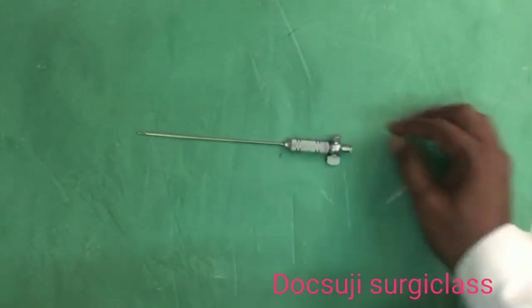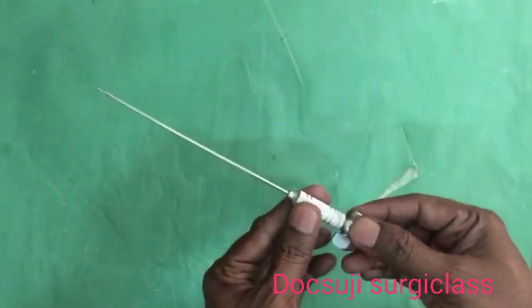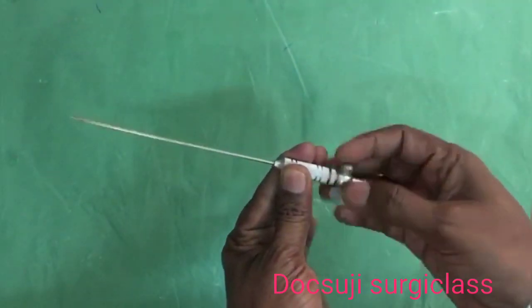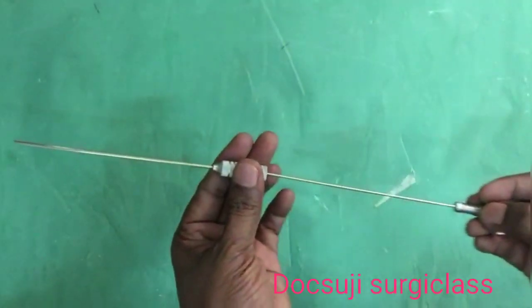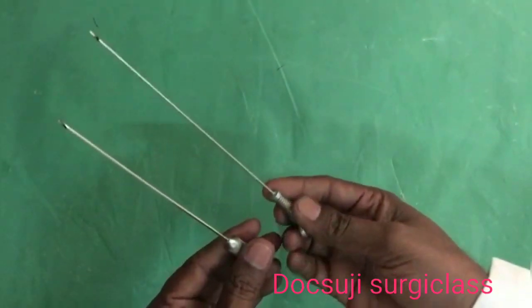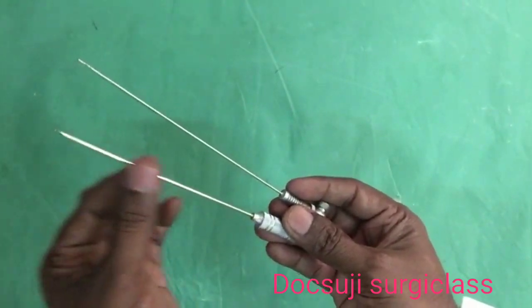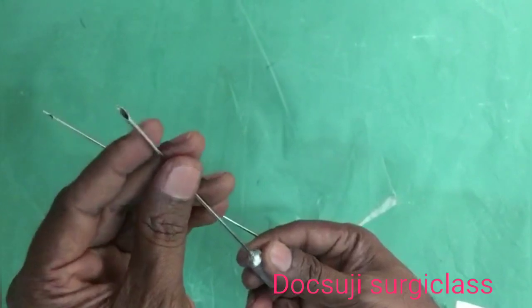This is the Veress needle. It has got two parts, outer sheath and inner sheath. I am just unlocking it. Now you can see that in my right hand I have the inner sheath, and in my left hand the outer sheath. The tip of the outer sheath, you can see, is a beveled end and it is very sharp.